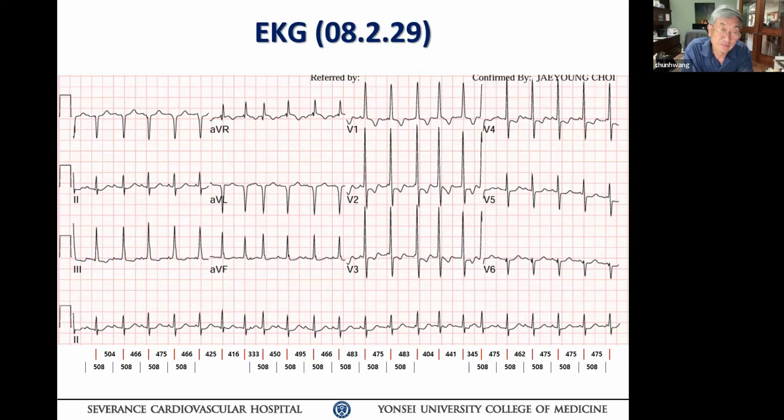The next one, following number 7, does not even have a preceding P wave. So this one is not conducting, okay? You see the P right behind it after the QRS complex. It's basically the P wave marching through. So there's no conduction here. Now the question is, why is it irregular occasionally? That would be something we have to figure out, right?